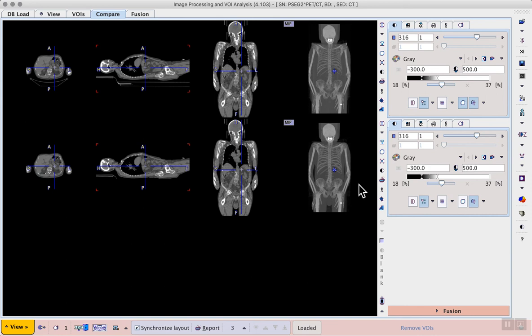Here we see the gap between the abdomen and the arms in the middle row, and we can see that the bed was clearly removed. This process could be repeated, targeted around the head to remove the head support that is still present and that appears in the MIP. And for later examples, we've done that for you.